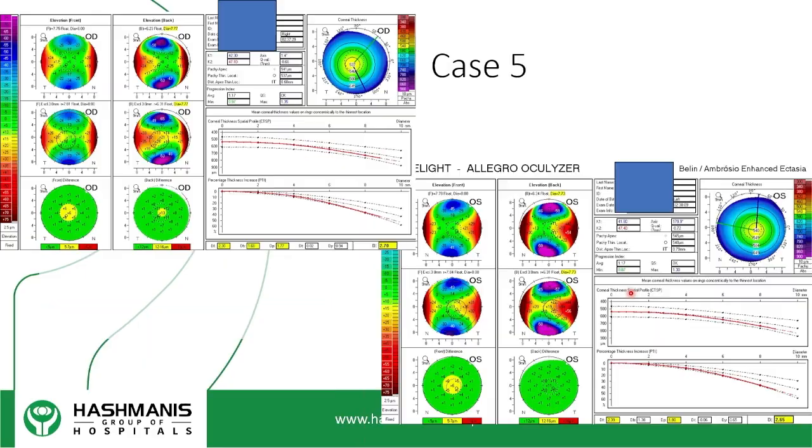And it's in both eyes. Now it's exaggerated the cone. If you see, the enhanced best fit sphere has exaggerated the cone as well, and the D value has gone abnormal. But this is someone I would highly suggest redoing all of these images, because if you redo these images, it could become normal. The diameter it's actually using is 7.7 millimeters, where it should be using 8 millimeters. So it can be purely out of a lack of imaging that it's giving me this information.